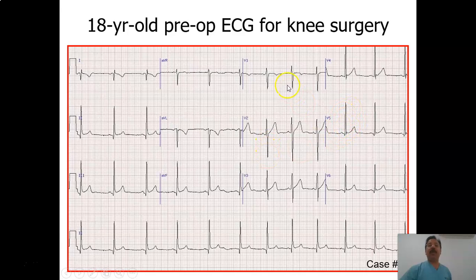No left ventricular hypertrophy, no right ventricular hypertrophy because there is no tall R wave in V1. ST segment elevation, really no. Maybe some doubtful ST segment elevation, maybe these notches are benign early repolarization changes, or may not be, not very obvious. No ST segment depressions.